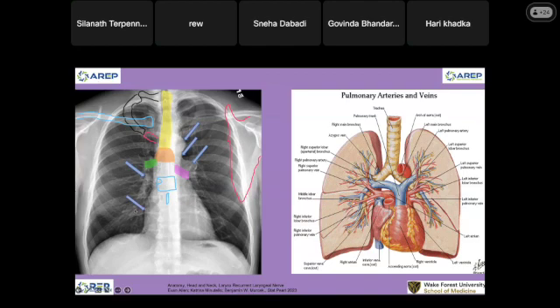Okay, and then for the lateral part of the cardiac shadow here, what is this? So this is our heart. Left lung has two lobes. What is that? This is the fissure, the long fissure. So the whole thing is the upper lobe.